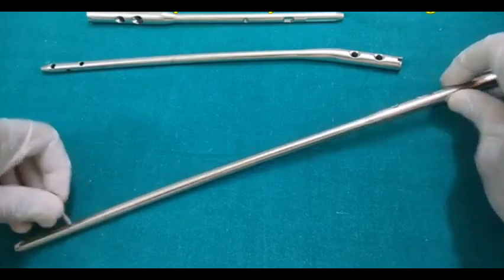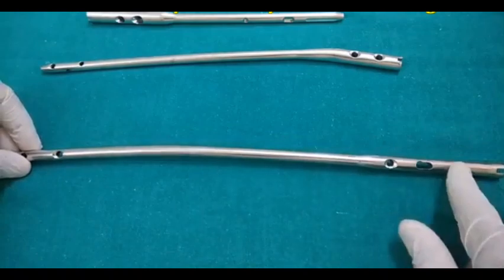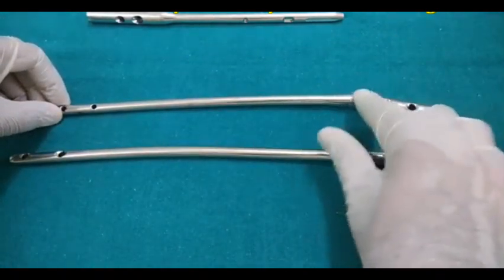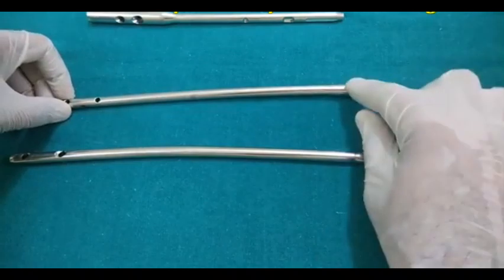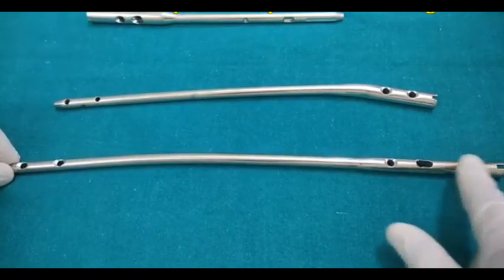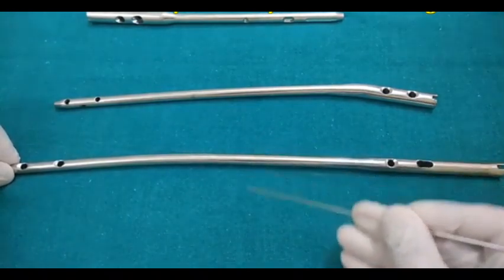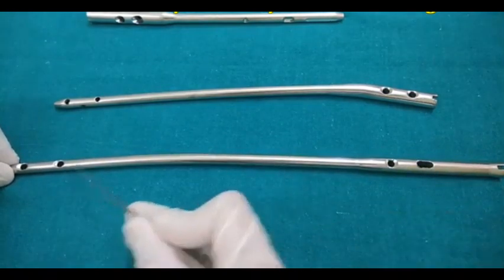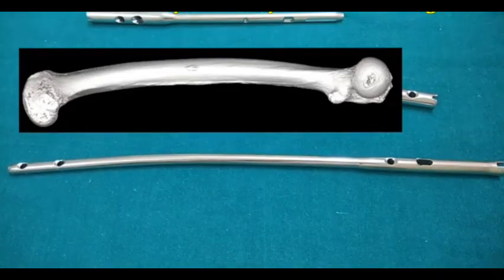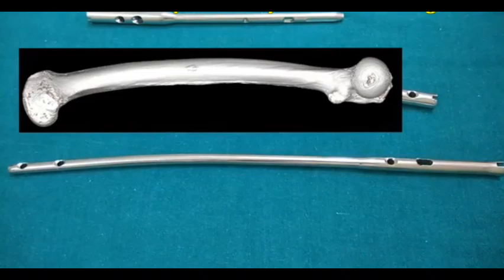And how to identify this nail? This is actually the femoral nail because there is no bend. As you see, this is the tibia nail. There is a Herzog bend in the proximal fragment. This is about 11 degrees. And in this nail you can see the convexity. This is the anterior side, and this is the posterior side. So there is a slight curvature in the nail to accommodate the curvature of the femur bone, because the femur is also bowed like this. So this is the femur nail.